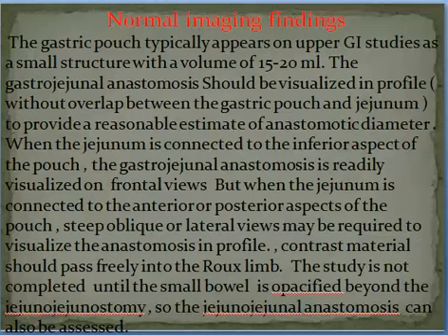Contrast material should pass freely into the Roux limb. The study is not completed until the small bowel is opacified down beyond the jejunojejunostomy, so that the jejunal anastomosis could be assessed.